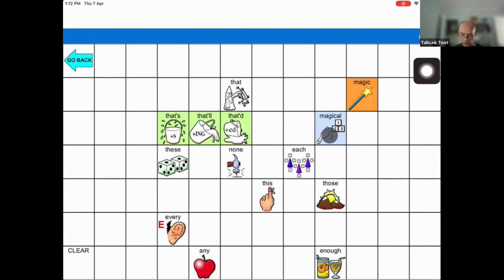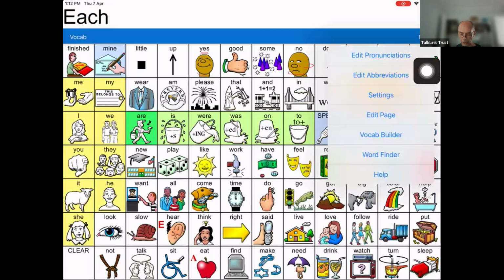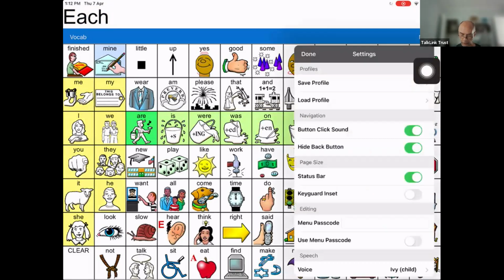Yeah, so you can now see where I'm touching on the screen. This is a little bit fiddly, because as soon as the iPad idles, when you don't touch it for a while, it disappears, and then you need to restart it again. The other thing that's fiddly about it is if I go into the menu here and say I'm going to go into my settings, for example, I know it's working because it's turned itself off.